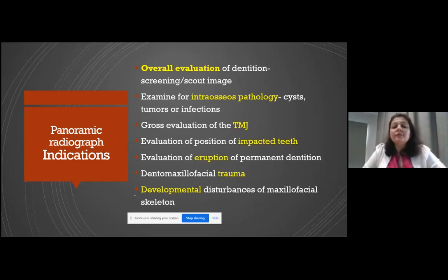Evaluation of eruption of permanent dentition, a must radiograph before you start orthodontic treatment. So to understand where exactly your teeth are located and at what point of eruption they are in at the moment of starting the treatment.